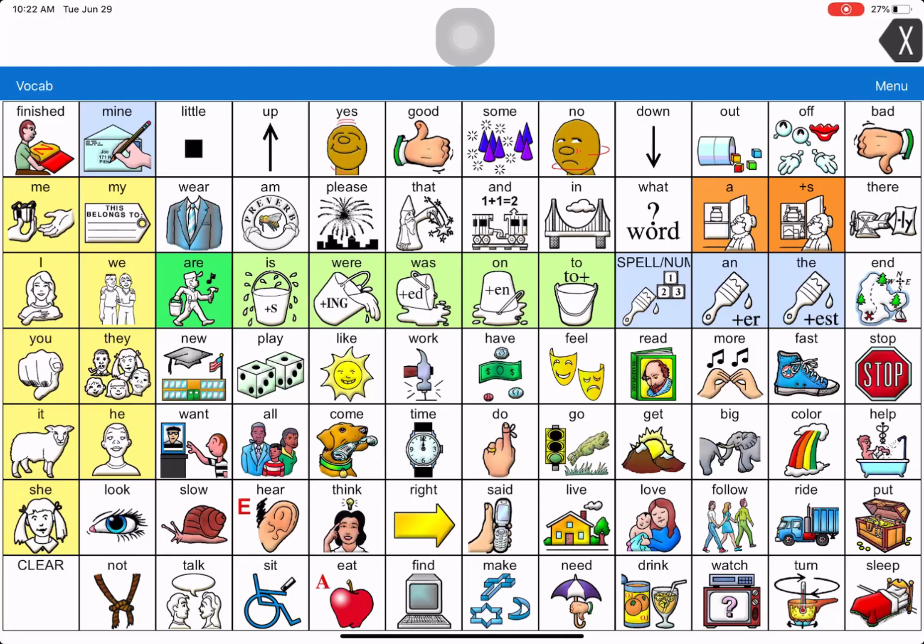All right, when you're using LAMP Words for Life, sometimes when you're following an individual's lead, you want to use a tool called Vocabulary Builder. Vocabulary Builder is a great tool. It allows you to follow the individual's desire to say something, and you see they want to say something, you can give them that word where it's more isolated and easier to see.